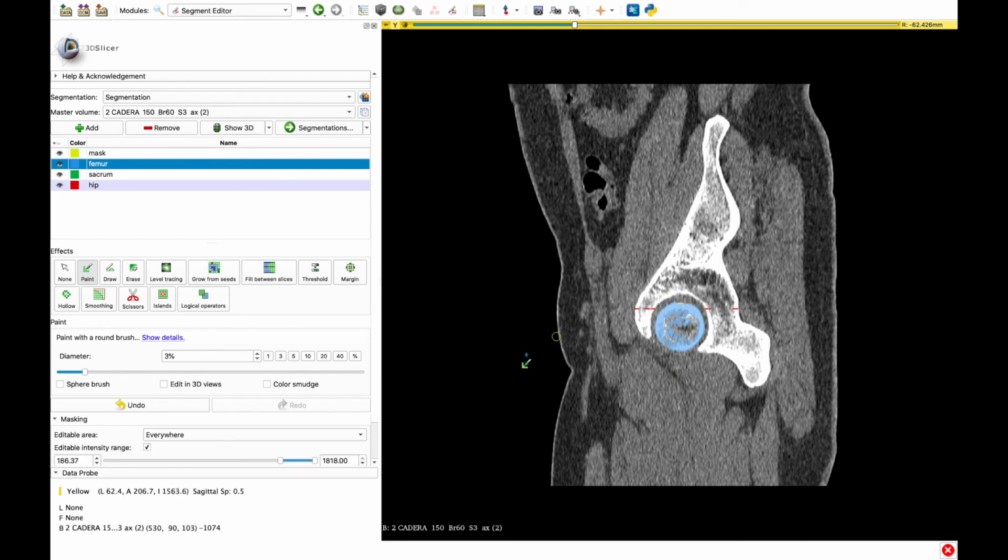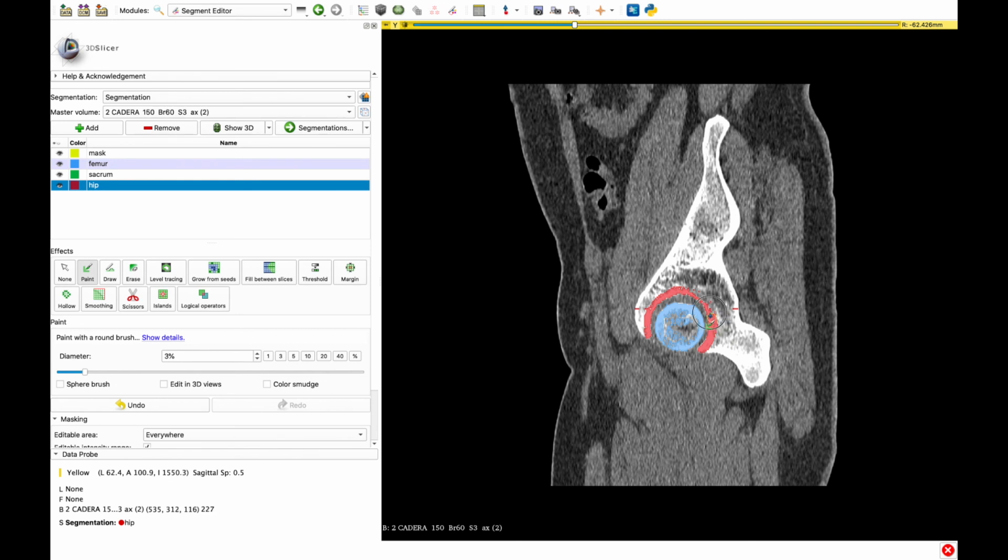And like before, accuracy is key. And now we're going to get our hip colored red. And we're also going to do the same thing for the green section. I'm probably going to go back and edit this section after I record and speed this up a bit.